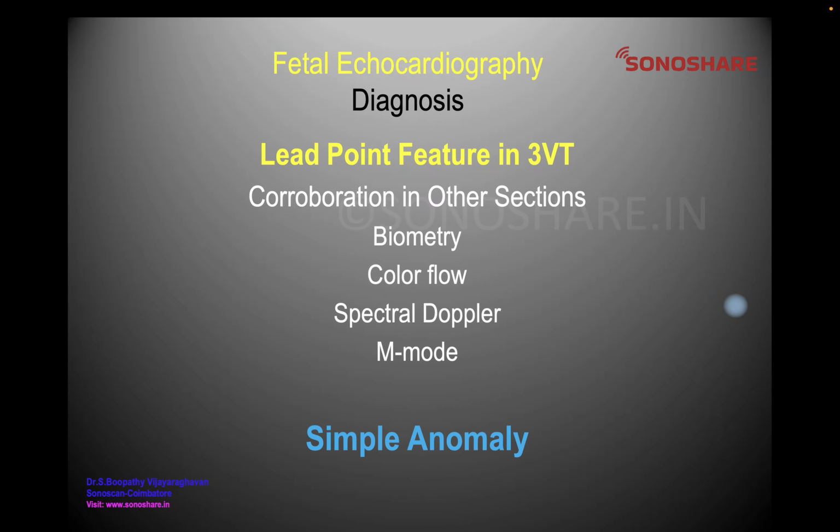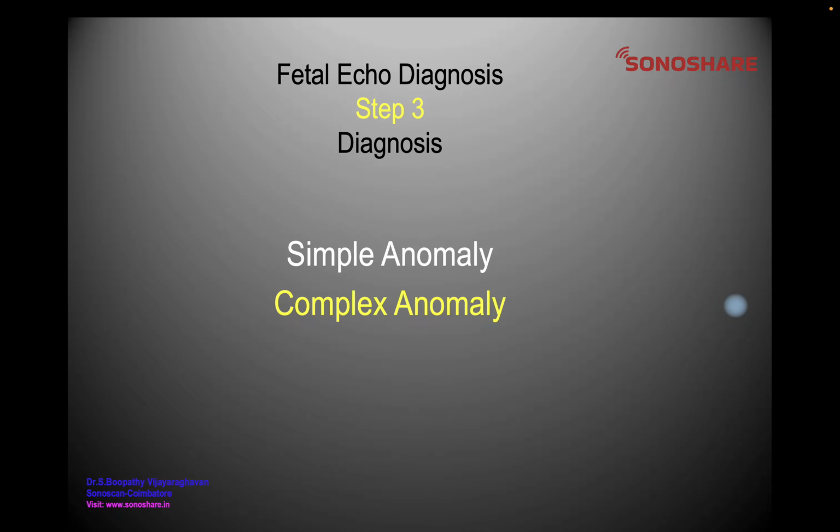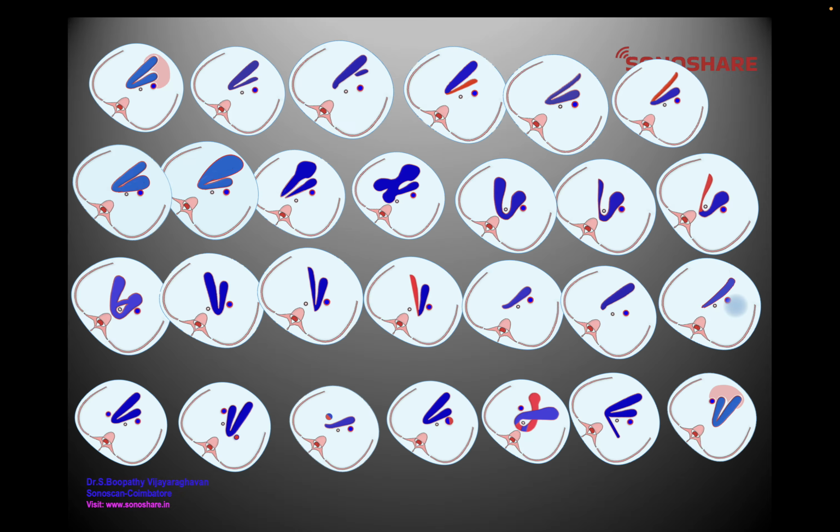With all this, you arrive at a simple anomaly. If it is not simple, it can be complex. So in that case, we have to do a sequential segmental analysis.